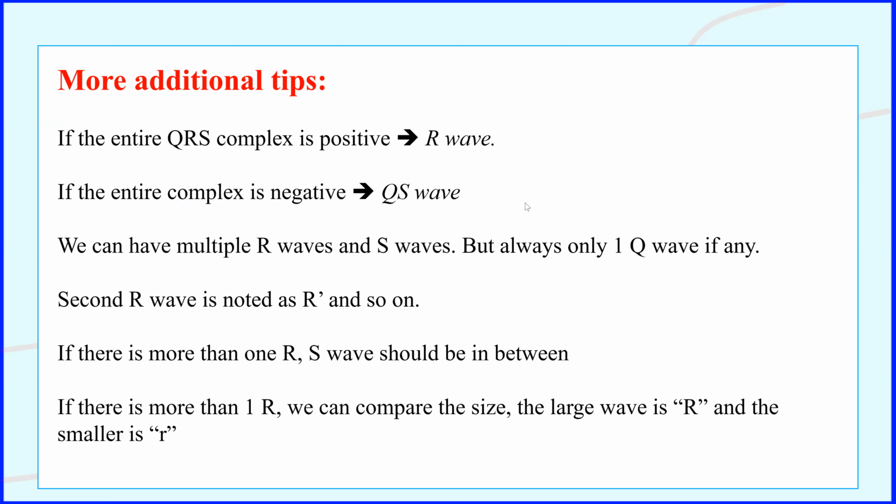Okay. Now let's apply these rules to our QRS complexes here. I will give you a variety of examples, and you have to test yourself. So feel free to pause the video to try to test yourself. So what is the name of this complex?